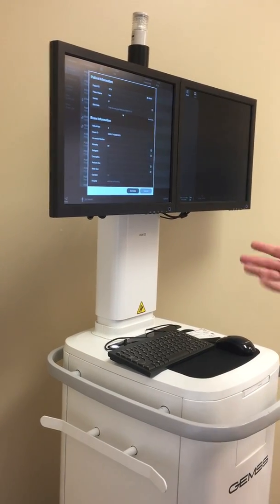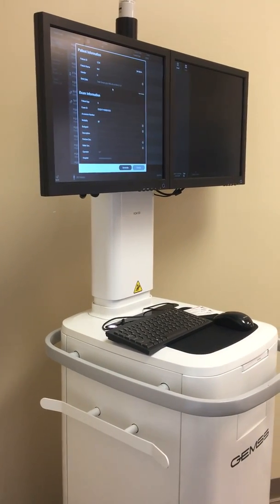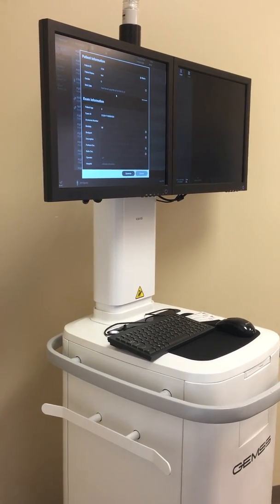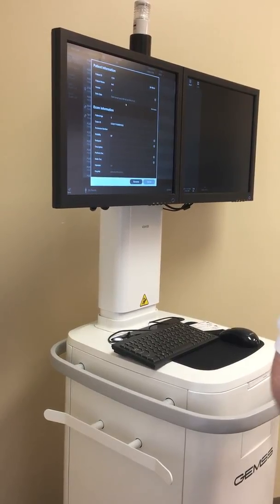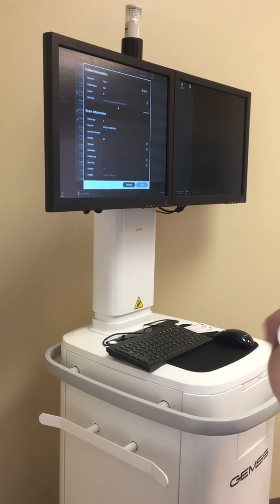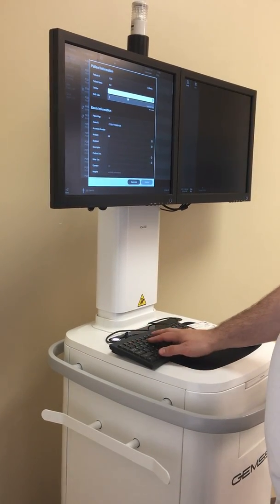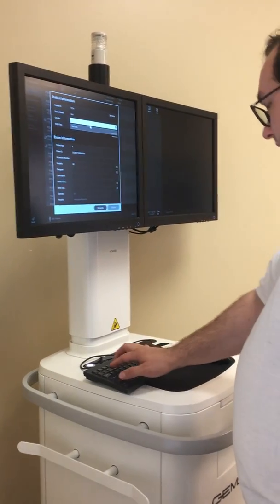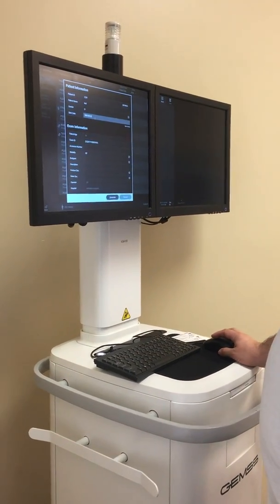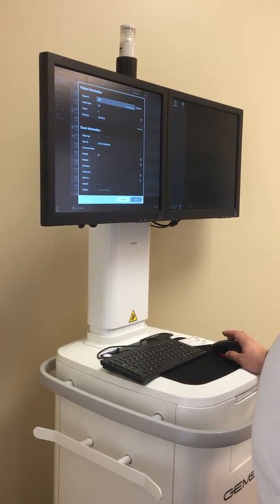So right now, that's kind of what it is. I'm at a point with our Korean engineers where we're making some revisions in the software, so at some point it'll probably accept any date that you put in. But for right now, that's what it is. So if the doctor decides that you need to put in all the demographic info and everything, this is how it would be. Then it'll calculate the patient age. Then you could generate a study.